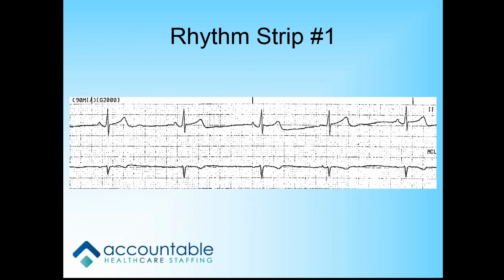Okay, Eleanor. Yes. Are you there? Yep, can you hear me? Yeah, now I can hear you. Okay, sorry. Let's take a look at this rhythm strip and start dissecting it.